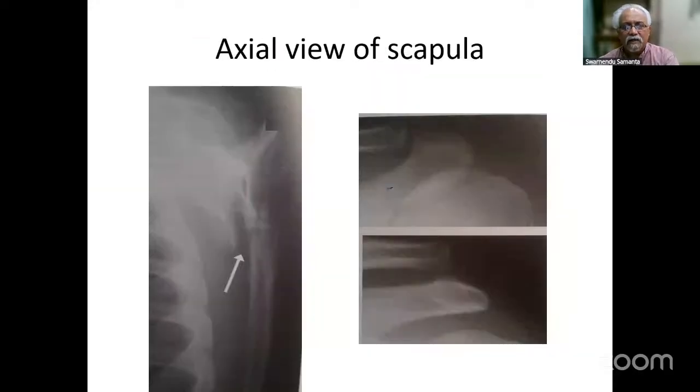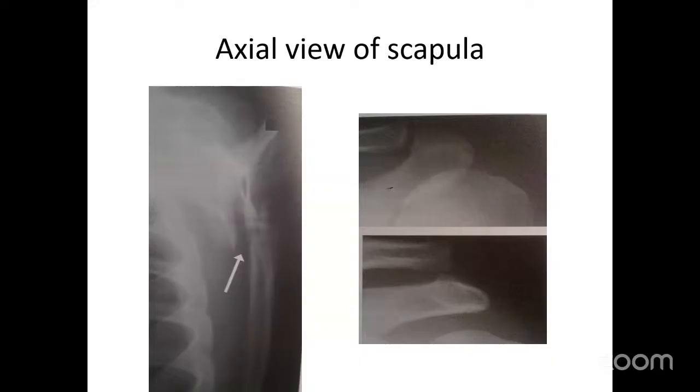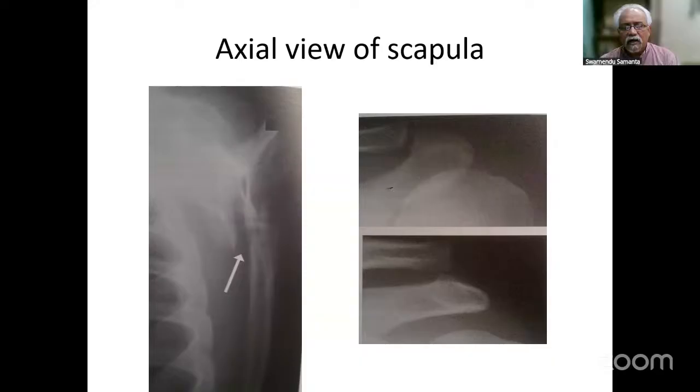So in the trauma series, somebody was asking for the lateral view or the scapular view. What is the importance of how it is taken? You don't have to take the classic axillary view which we used to order, but that is absolutely not necessary. This is just like an orthogonal view and is easily taken with comfort without moving the arm.